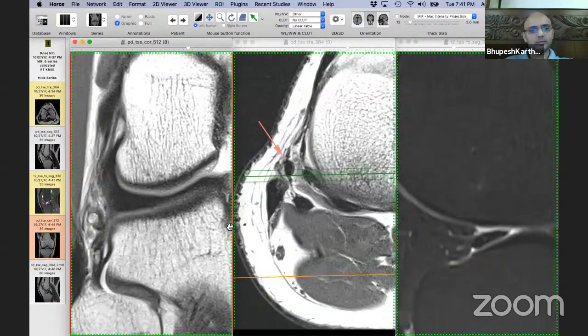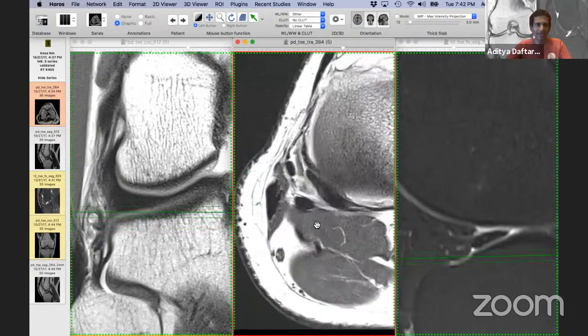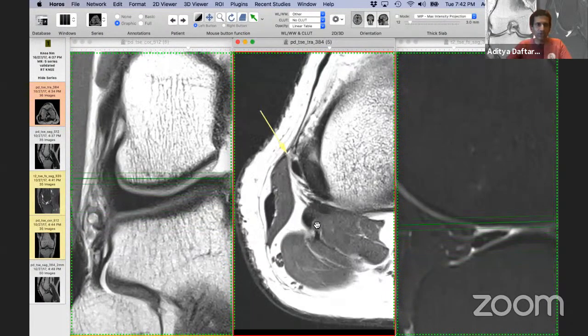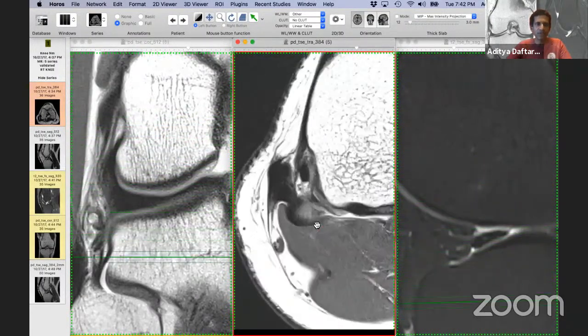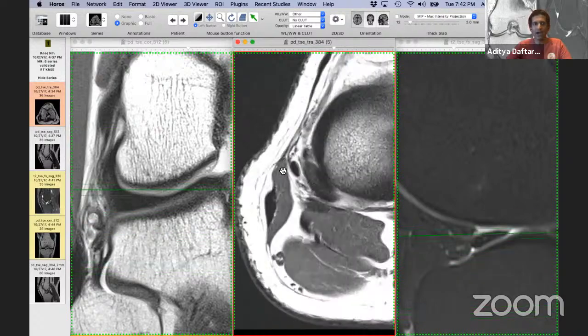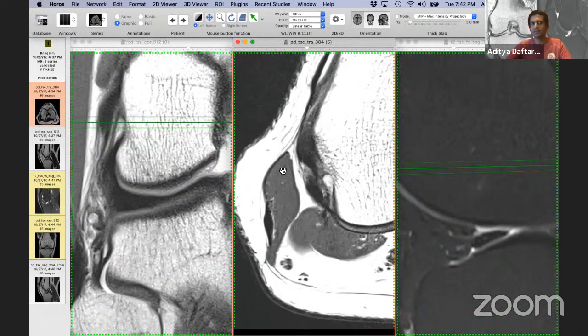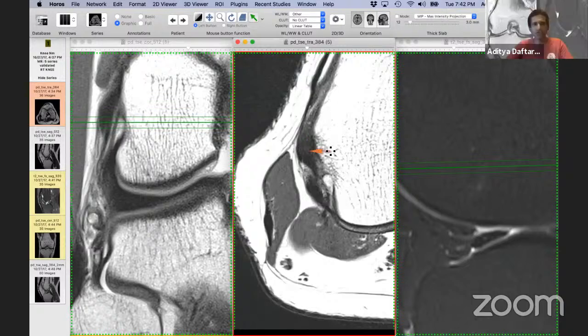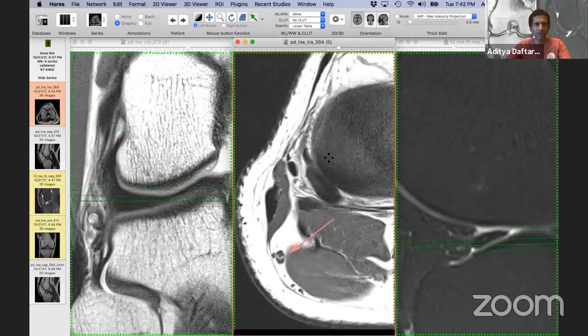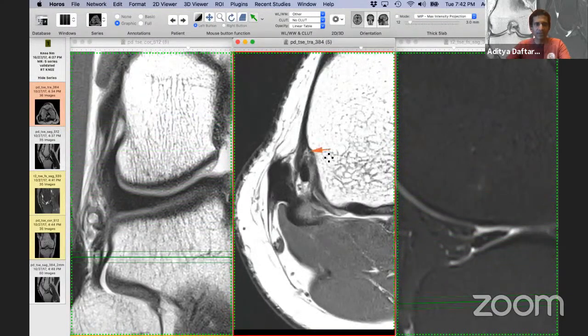Okay. And when you slice through it, as I come up, it goes from anterior to posterior. The start is more anterior and the end is more posterior. Do you get that? Can you see this? So if I were to show you, this is one arrow. I'm going to copy this arrow and we're going to go down to the bottom of this, where this ligament is. You can see this, sorry, it's more like anterior. So this is posterior and this is more anterior. You see that? So it's running an oblique course.